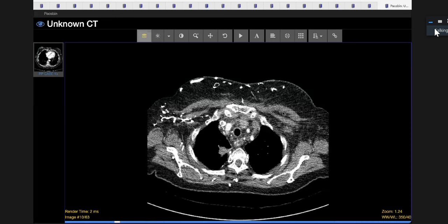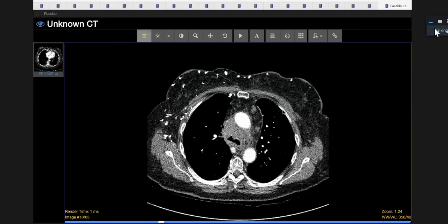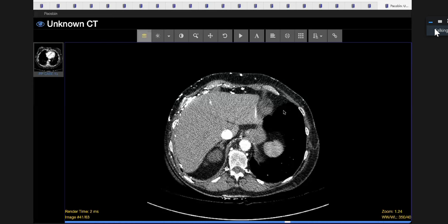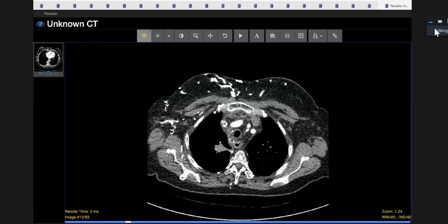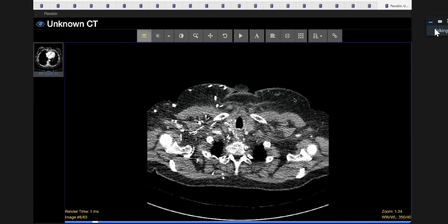And just have a look at this. Again, you can tell me the pathology, but you can also tell me what the patient looks like, how they've presented. So this is possibly a patient who presents with upper limb swelling and a lot of edema. Also neck swelling and redness, plethora of the face. That's how it's described, isn't it? Because what is it?